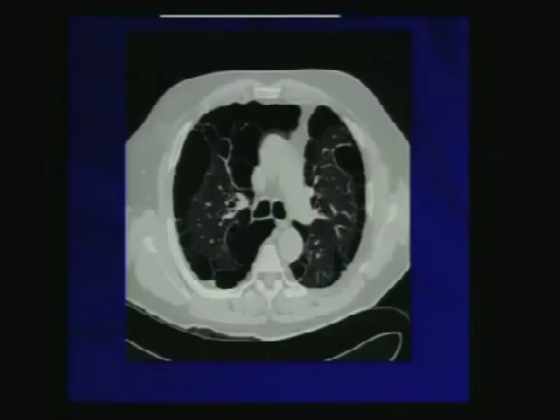And then also, as part of centrilobular emphysema, there is one particular emphysema that has this peripheral typical distribution. We call it paraseptal pulmonary emphysema. And you see those large areas of coalescence of blebs and bullous disease where you have preservation of the central and medullary portion of the lung. But again, this distribution will allow you to recognize this paraseptal pulmonary emphysema.